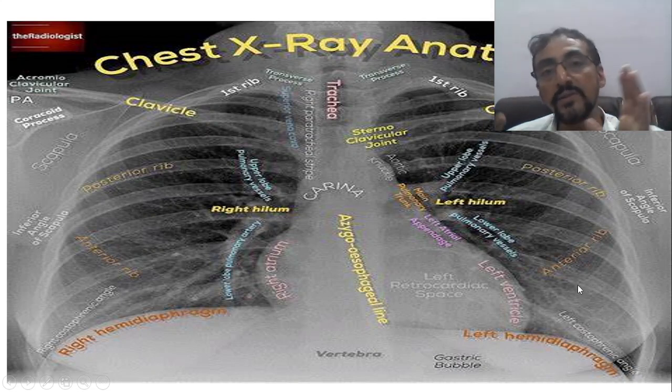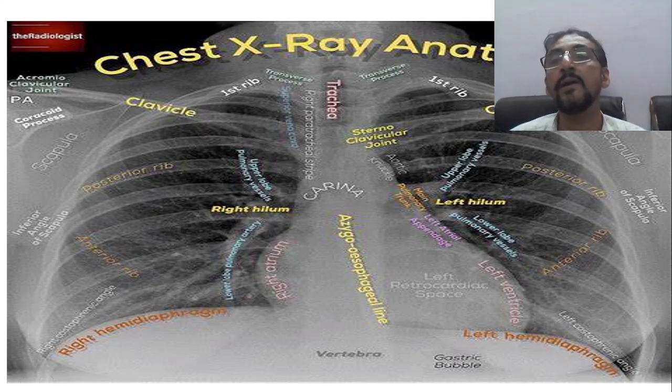So this is about the midline structures. Okay, so we should know the minimum midline structures. Any doubt in this? No, sir. So I hope this is very clear now. Now we will go for the next structure.